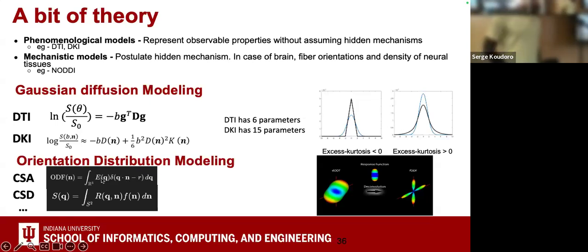That is more detailed. So here we have E. It's called E, but it could be S. E has been chosen because it is the normalized signal. But you could see it as a, where is my cursor?